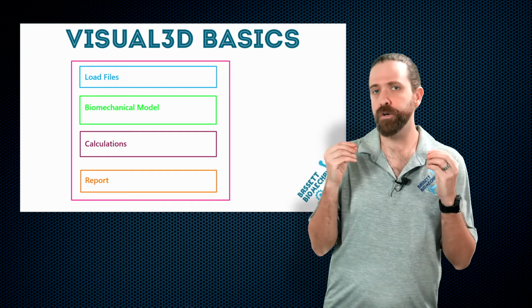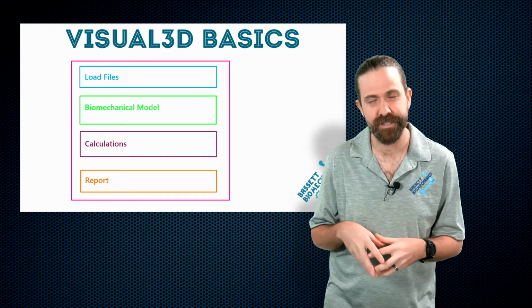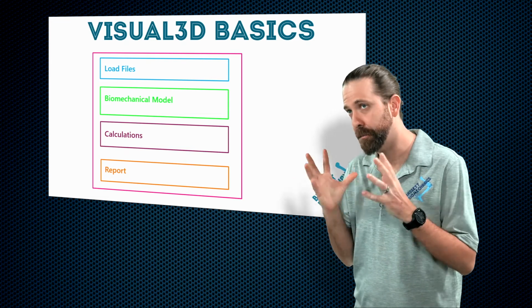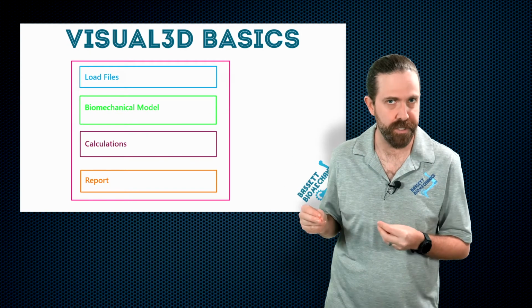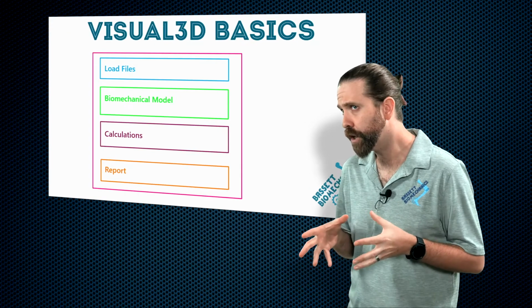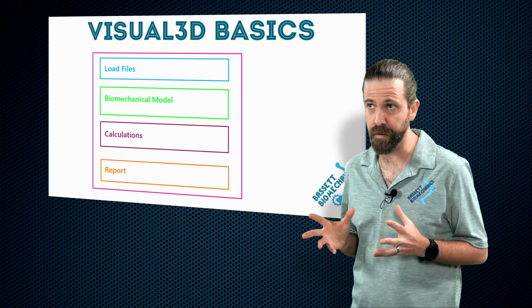We want to click as few times as possible to perform all this. Our motto is sort of be as lazy as possible, but that means that we have to do the work now so that later on, for every single patient or subject, we have to do as little work as possible. So our goal is to reduce the number of clicks as much as we can.